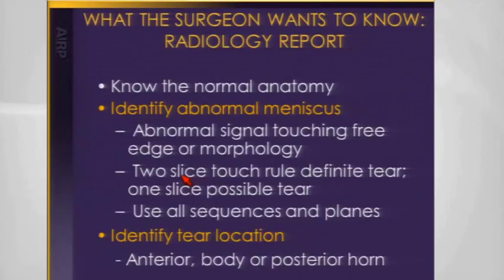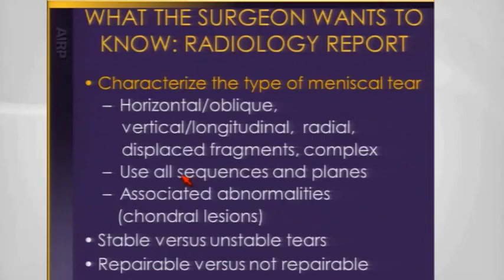What if you look at your images and it's Friday afternoon and you're tired and you kind of sort of think maybe it touches a free edge? What do you do with that? We call that, or used to call it, the iffy meniscal tear. If you have to work that hard to change the contrast, I like to make the New Jersey rule. Forget about it. That's not a tear. It will not be a tear at arthroscopy if you have to work at it that hard. I've also tried to say we need to describe what kind of tear we're dealing with and be very careful about displaced tears. I say we call, you know what that means, right? That means the resident or the fellow calls. Why are you using the we term there? But it's important to get a hold of them.